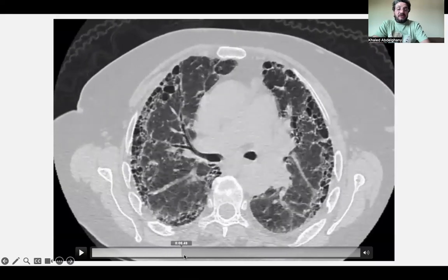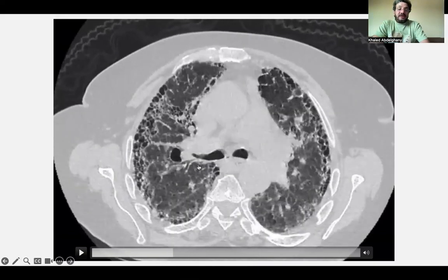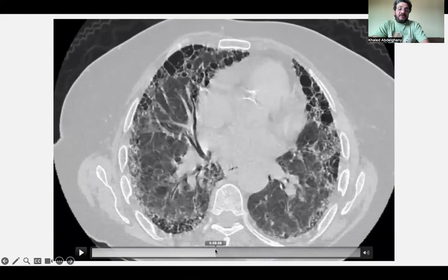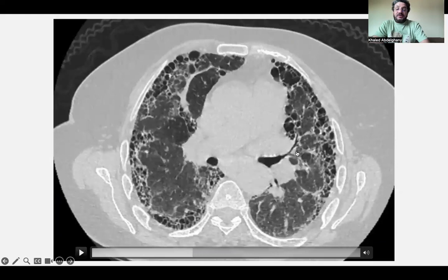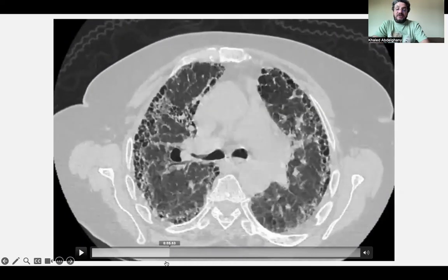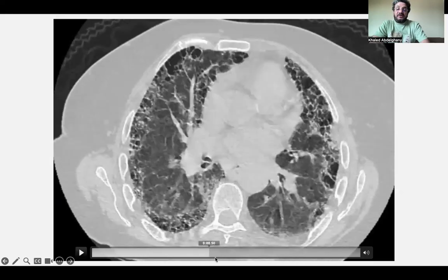We saw here the right side. Let us see here again, this is for the right upper lobe still. For the lower lobes, you see the bronchi are tapering, no bronchocentricity. Let's check for the left side as well to confirm the idea. No bronchocentric fibrosis, no traction bronchiectasis. So the fibrosis is confined to the periphery, which is the criteria of typical UIP.